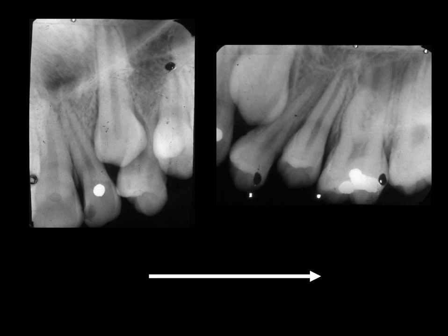In this case, we take another radiograph, more posteriorly positioned, so our perspective has changed from the front of the patient to the side of the patient. What can we see here in terms of the shift, the parallax shift of the canine tooth? Well, on the anterior radiograph on the left, we can see that the crown of the canine is just slightly overlapping the edge of the lateral incisor and overlapping the first premolar roots quite a lot.